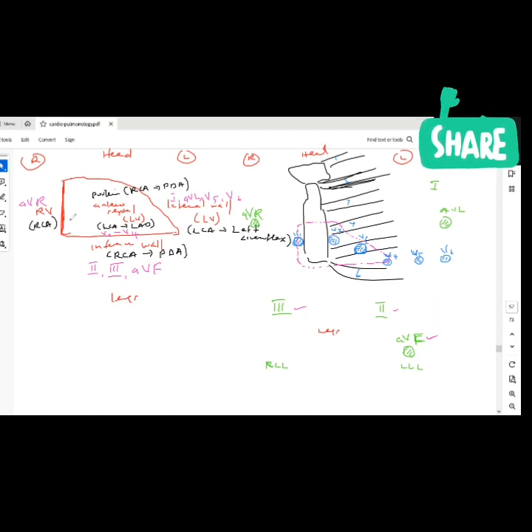So what else can I do to look at the right side? I can look at our precordial leads, the V leads on the chest. I can actually put them on the right side, because the way they are now, they're on the left side. If somebody is suspected of having a right ventricular MI, we can reverse these leads and put them on the right side.